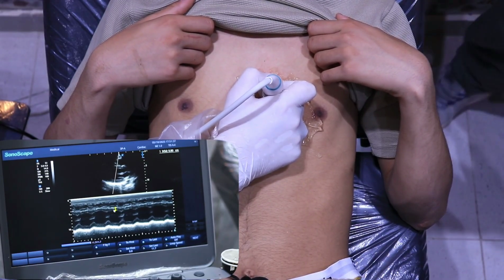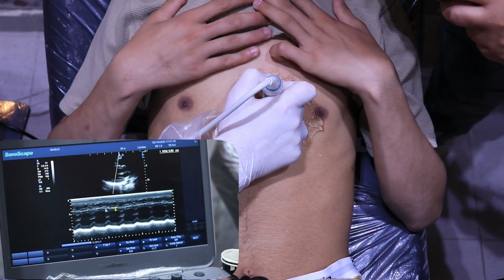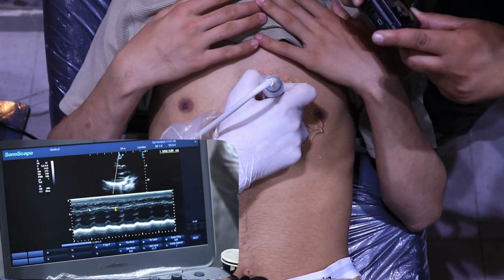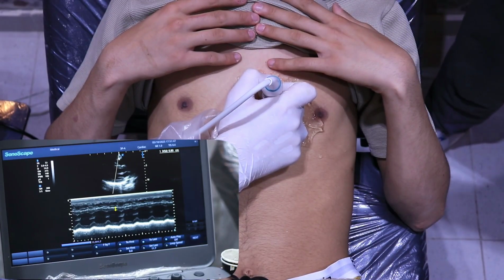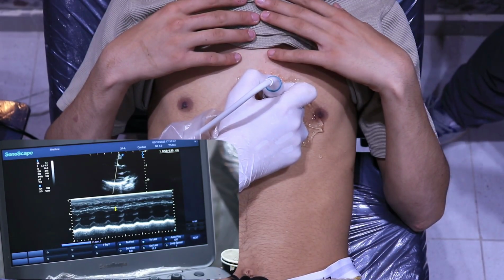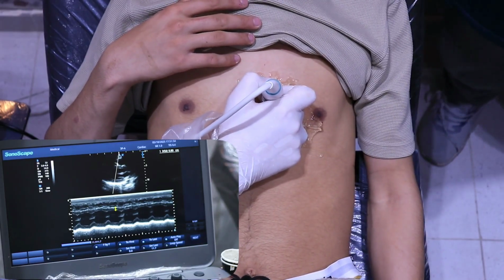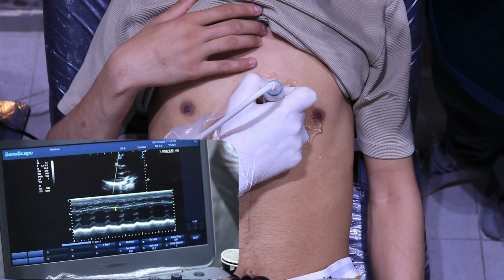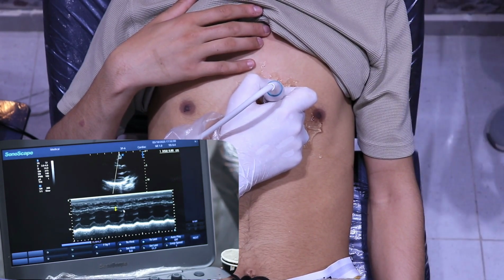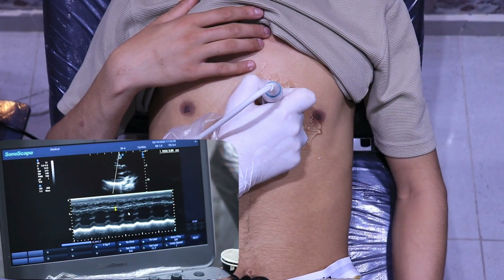This is the question that we had before. So you can see the line is going, as you see, with the muscle. To know this we have to look at the 2D. You can see the 2D here, this structure here is the moderator band. So this is the moderator band here, right? And what is the structure here? It's part of the chordae.